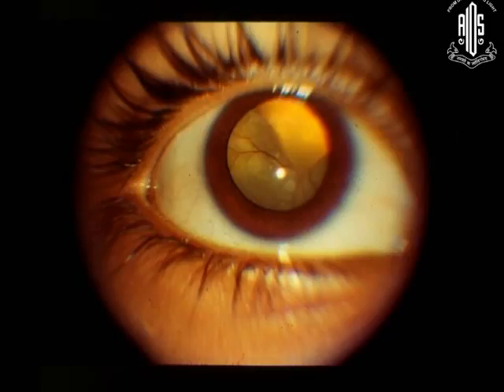In contrast, here you see a total retinal detachment, but this yellow stuff is under the retina. It is not within the retina. So this may not be obvious on a photograph, but if you look at the child under general anesthesia, you should be able to make out this lesion is under the retina. And if you see, here the reflex is white, and here the reflex is yellow. It's pretty much obvious.